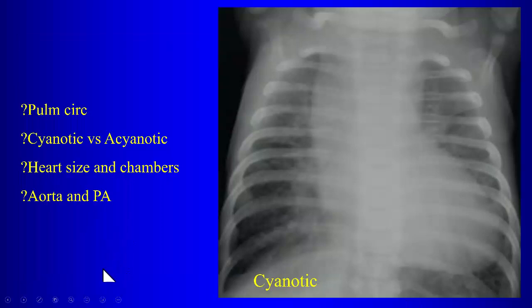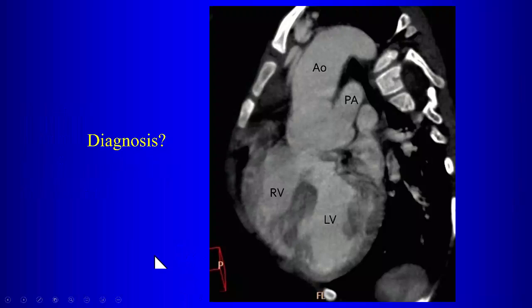All right, so here, pulmonary circulation increased. I'm telling you the patient is cyanotic. You're in the category of admixture lesions, the three big ones there. Total anomalous pulmonary venous return. Looking at the plain film, what might you favor? It's kind of like a snowman. What else could this be over here? Right aortic arch. If it's a right arch, what would it be then? What's the answer? Truncus arteriosus, yeah. So here's your VSD, there is your truncus, there's the aorta and the pulmonary artery.